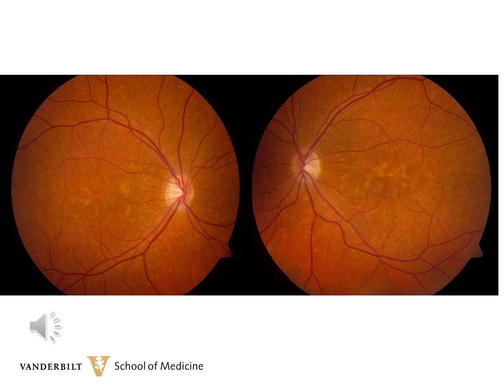This is a patient of one of my colleagues, Dr. Mylan Brantley. This patient is 47 years old with vision of 20/20 in the right eye and 20/25 in the left eye. You can see the flecks on the left eye look a little bit like a butterfly. However, the yellowish flecks extend farther out into the peripheral macula than on a typical butterfly pattern dystrophy.